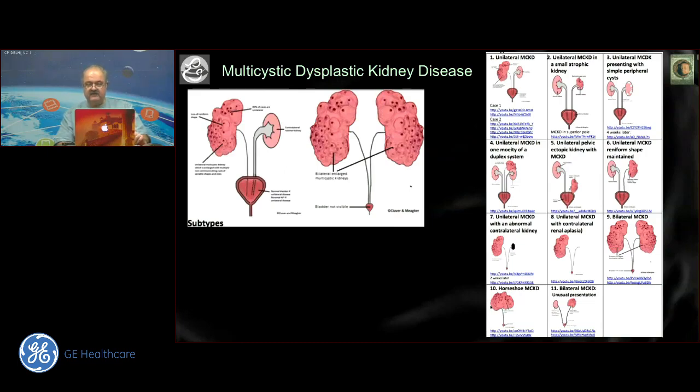Remember that you could even have a multicystic component in a horseshoe kidney as shown in the bottom-most left picture. This chart again is available as a free download on the ISUOG website or on the internet, anywhere, as a chart by Simon Meir and his colleagues.